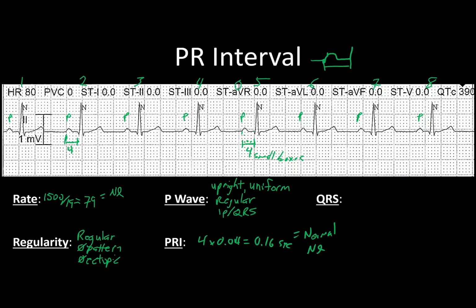Last little bits that we'll add into this is the PRI is constant, and that there's no pattern to it either, because there will be certain rhythms where that is important.